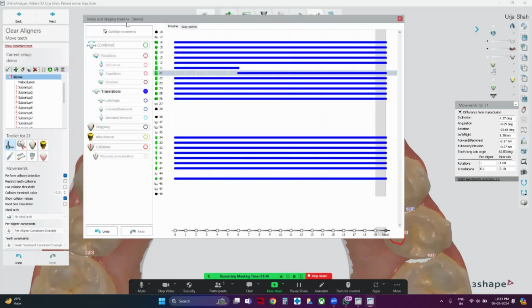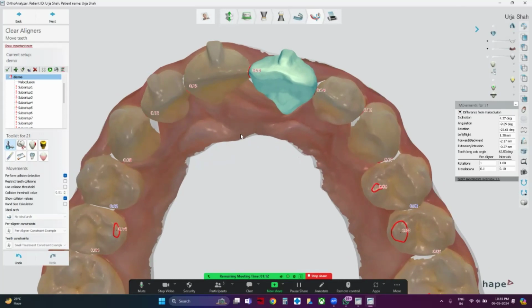The staging timeline option allows you to stage each and every movement. You can actually and practically customize every movement, like the forward, backward. So if you want it to intrude first and then rotate first and then intrude, and stuff like that. It's crazy what you can do, and you can even make parts of it. So that's how you can try and do that. Is this clear? But at least sufficient enough for you guys to start with something.